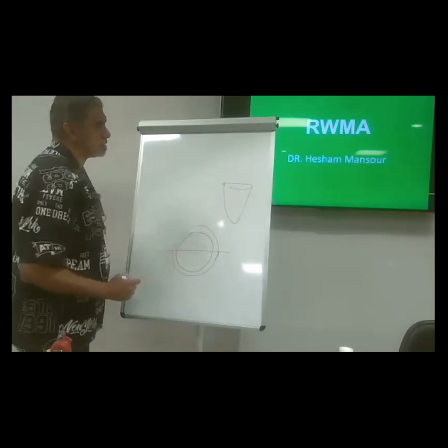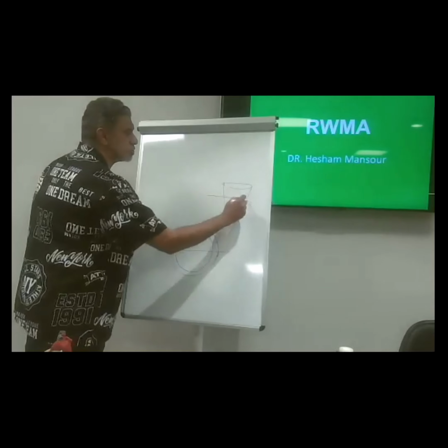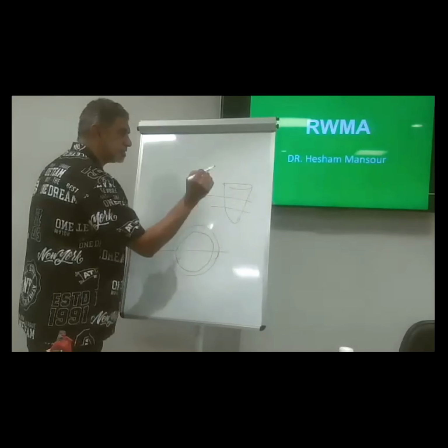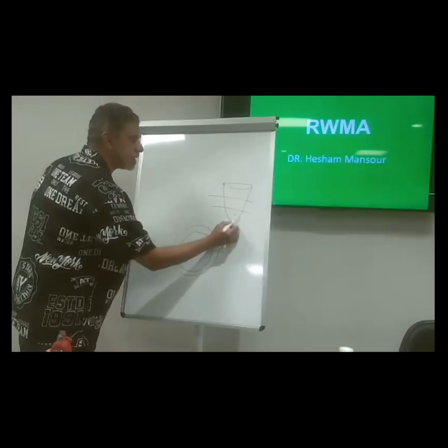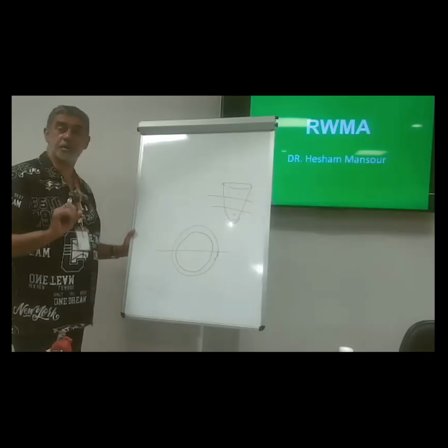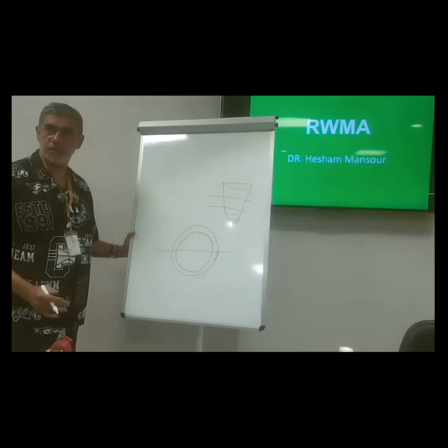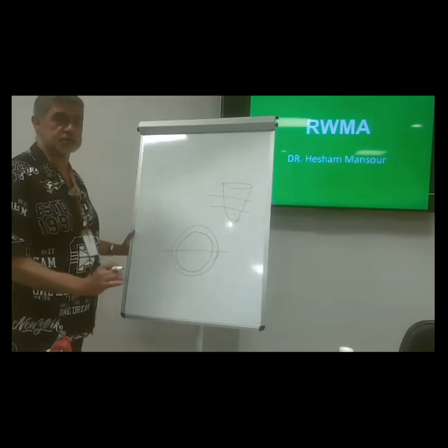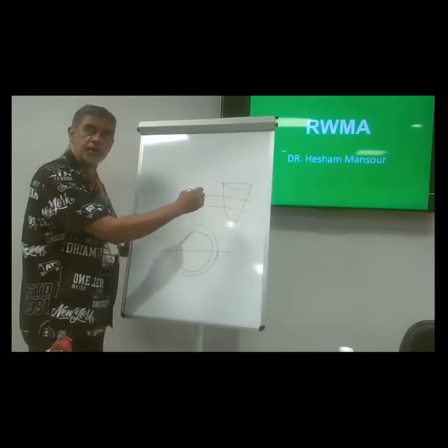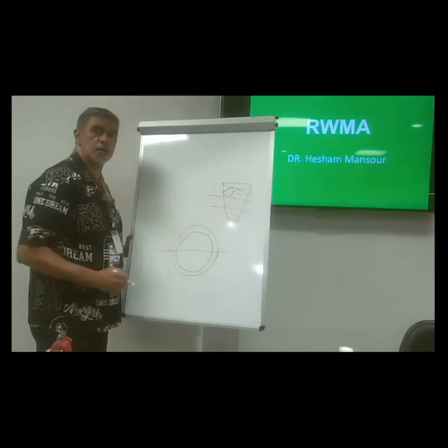This is the LV in a different shape. Cone also. We need to divide it into 3 areas: base, mid, apical, and apex. But it has a significance because it is peculiar to LAD supply. So how to define this base? By the mitral leaflets.